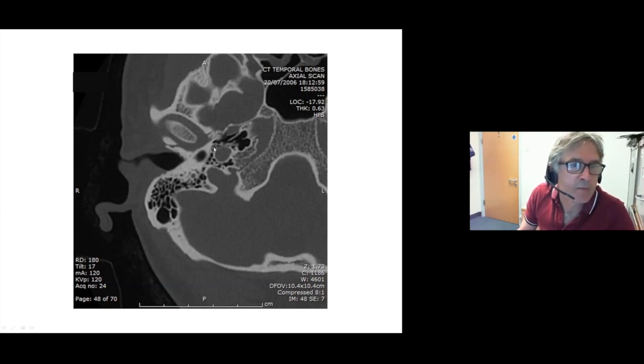Anterior to the jugular bulb is the carotid canal. So that's the carotid canal, and there should be a well-defined bony spur separating the two. The margins of these should be absolutely crisp all the time. Nice corticated bone, even if you've got well-pneumatized mastoid air cells. This is the petro-occipital fissure, anterior end of which is the foramen lacerum, and this sits just below the horizontal portion of the carotid canal. So just above here will be the anterior most part of the carotid canal.